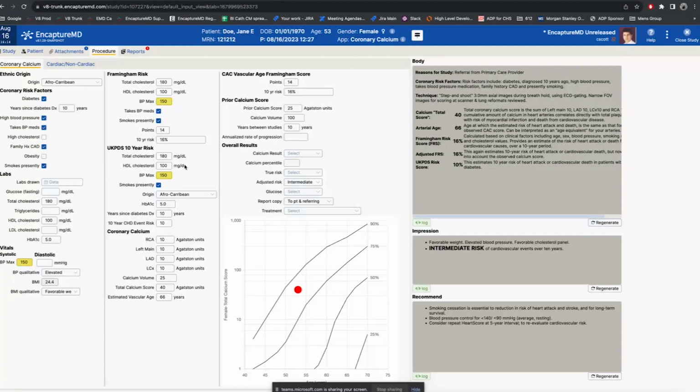So that's what this is. This whole page right here that I'm showing you is a risk assessor, and then you can see in the report itself the score, the arterial age, the Framingham score risk, the adjusted risk, et cetera, and then the overall risk is reported here. So yes, absolutely. Any other questions that came up? Not that I can see, no.